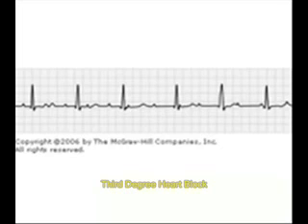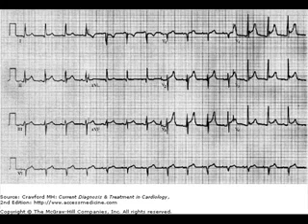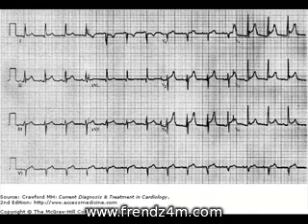And now let us go to see some other. This is pericarditis. In pericarditis you see a diffuse ST segment elevation. You can see ST segment elevation in almost all leads, and the voltage is also less. So this is characteristic of pericarditis, when fluid accumulates around the heart.